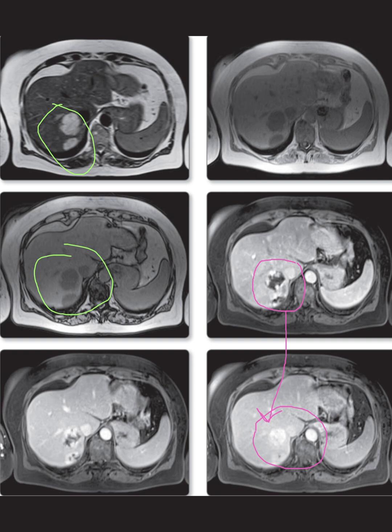When describing liver lesions, it's crucial to note whether they are solitary or multiple, their size, location, and whether they display a central scar. Additionally, the enhancement characteristics across different imaging phases can provide valuable clues. The background state of the liver, such as the presence or absence of cirrhosis, significantly influences the differential diagnosis.